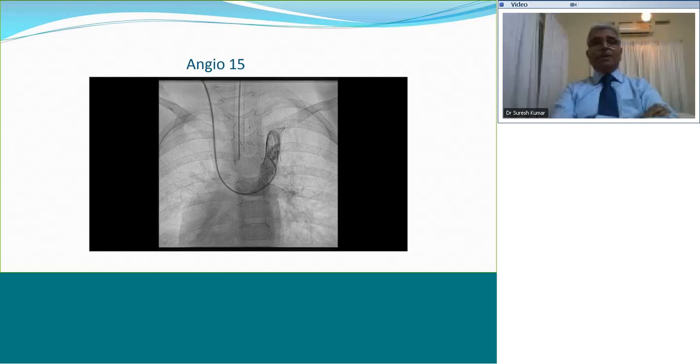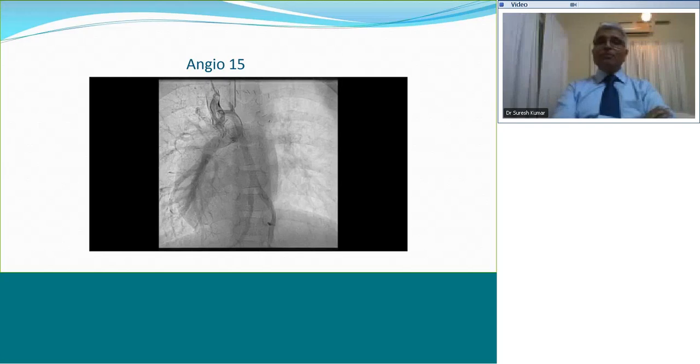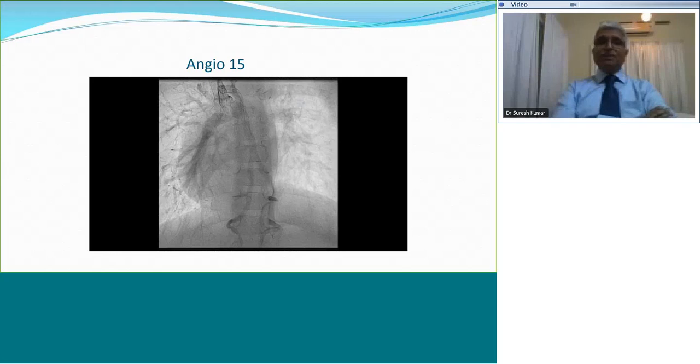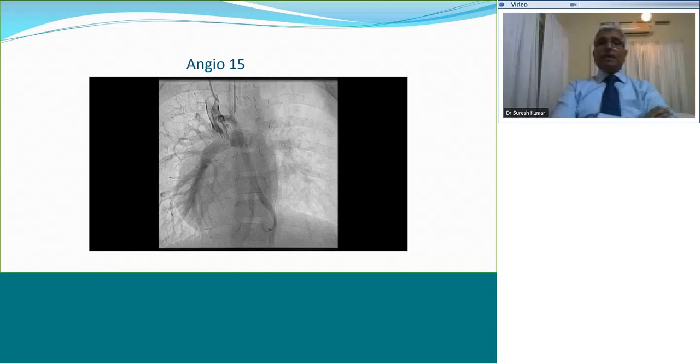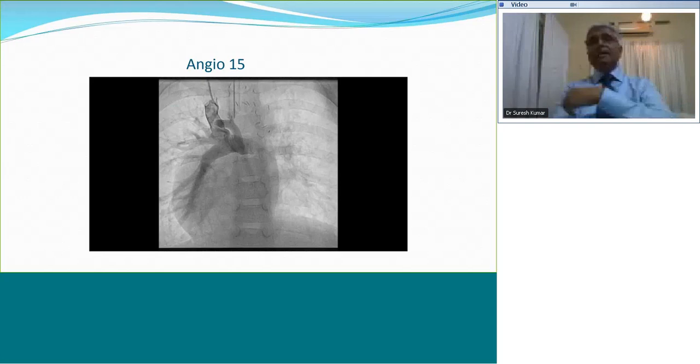So it's a bilateral BDG with a decompressing vein. And do you think you can name what the decompressing vein is, as its course is well seen? It looks like the azygous vein. See, it's joining the SVC at about a third of its distance. And as the vein is coming down, it is receiving veins from both sides of the lumbar vertebra. It is the lumbar veins that join together to form the azygous vein.